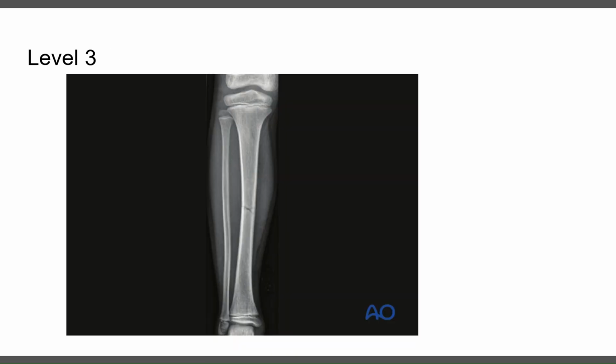looking at the picture. So let's go back to the same x-rays we looked at before. So here is that AP of a skeletally immature tib fib. We know this is the fracture, and we know it's the tibia. Now, before we called this a middle third tibia fracture, but now that we know those more advanced terms, we can call this a mid-diaphyseal fracture or a fracture of the tibial diaphysis.